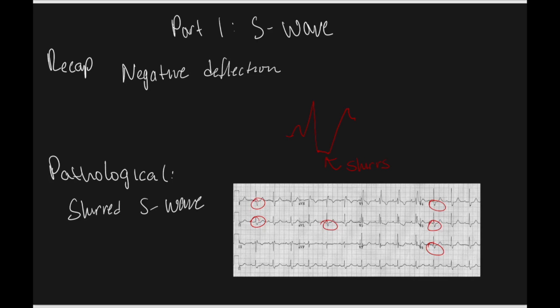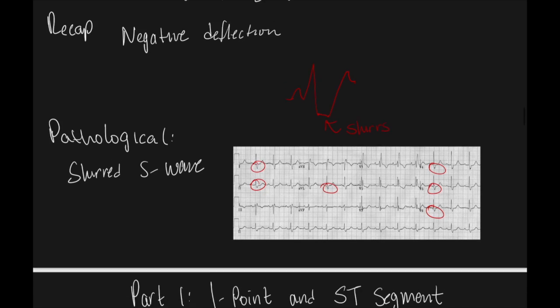That's called S wave slurring or a slurred S wave. That's really the only thing to keep in mind for the S wave.